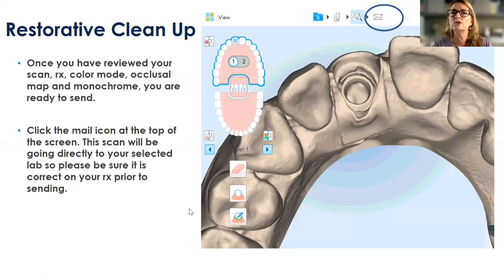This is a great question. Should the green dot be on the side of the scan body, or is it okay for it to be in the center of the hole of the scan body? You do not want to put the green dot in the center of the hole of the scan body, and here's why. I have seen it disappear, right? It goes into the hole and I don't know where it goes, but the scan body itself disappears. So I like to have it on the occlusal, but just outside of the hole, so it might be a little bit towards the buccal. Great question.